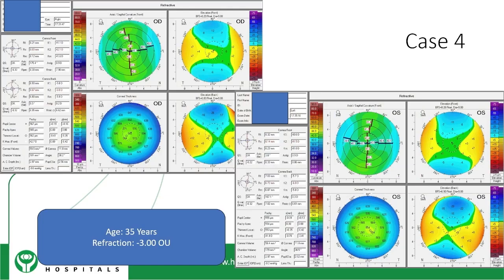If we try to apply those concepts to the interpretation of topography reports, maybe it will make it easy for the friends who just want to have a look and interpret, and who don't have the time to spend like the iconic figures of Dr. Dua and Dr. Hashmani. So the first thing we see there is false positives, false negatives and fixation losses.